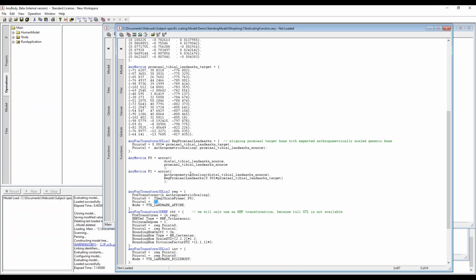This is just an example of how it can be done, so you can read this code a little bit more. I will put a little more documentation on what is happening exactly, but effectively the task is just to create two sets of corresponding landmarks, and then feed them into the pipeline of transformations.